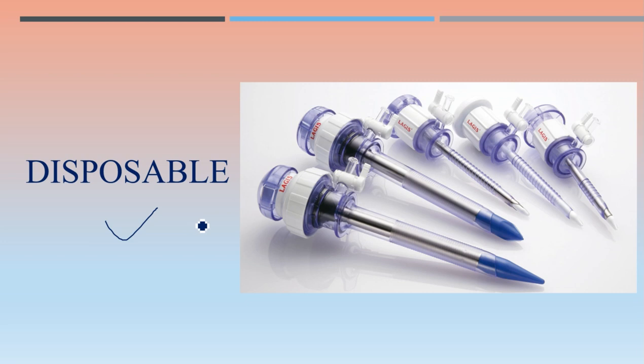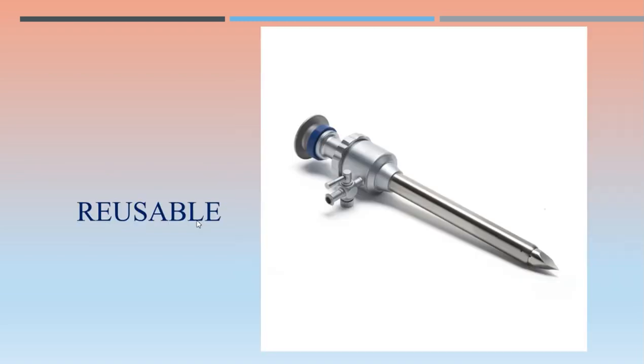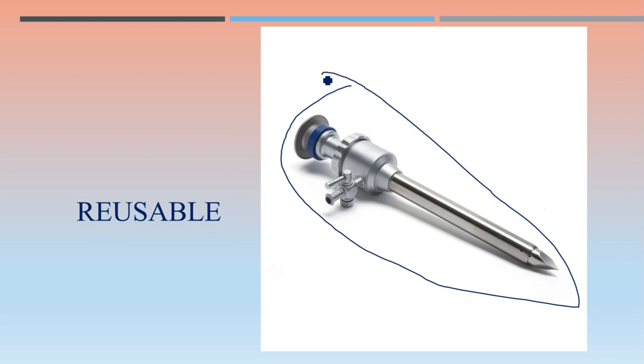Disposable means you use it one time and then discard it. And this is the reusable variety. Every time after the surgery you can sterilize it, and it can be reused. This is a 10 mm trocar.